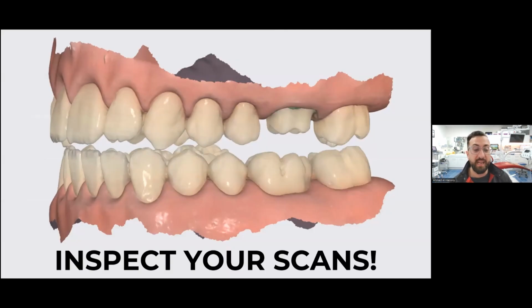And really, this is the next point, that you really need to inspect your scans. When you take a bite scan, you need to look at your scans and check them from all the different directions. Buccally is quite obvious if you've got a really big discrepancy, but the better view to look at them is when you open up the bite scans and you look at them from the occlusal view and you check it with a heat map. A heat map is a really, really useful tool to basically eyeball the arch very quickly. And if you see basically no contact at all on one side, you know that's probably an issue.